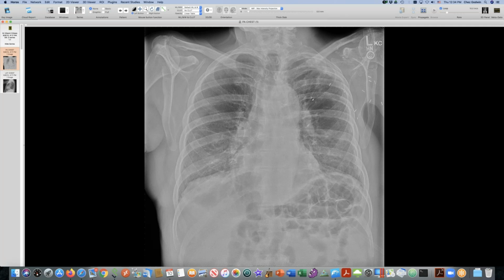So I don't know, what do you guys think? It's not normal, I know that much. Looks more neuropathic, but I'm no bone expert. Never had radiation with all those clips and whatnot there?